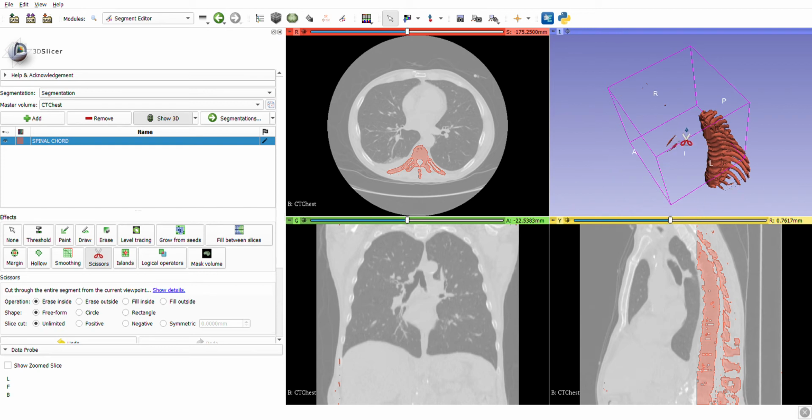So as you can see over here, there are some parts in what we can say open air. So I can select it over here, and then I can remove it. Since we are going to 3D print this part, it's very important that there is no single particle in open air, because then it will add a support while 3D printing, and it will cost me my material and my time, and definitely that will be a costlier process for me, and it will also not add accuracy to my process.